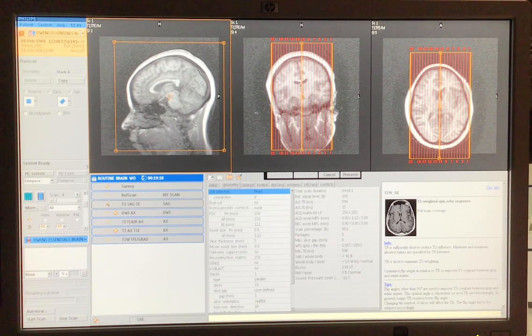The right to left direction is basically that third dimension, because remember, even though we only see 2-dimensional images, we are doing a 3-dimensional type of picture. That third dimension basically is your field of view with how many slices you have.